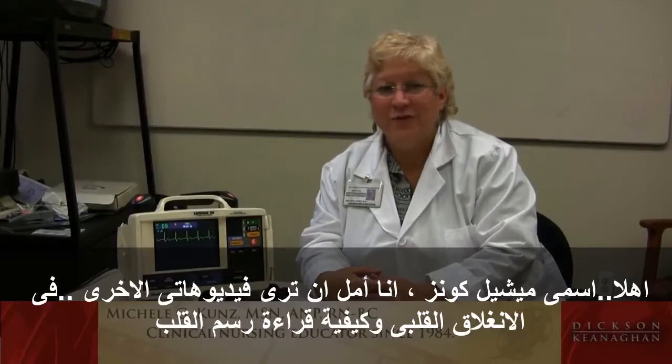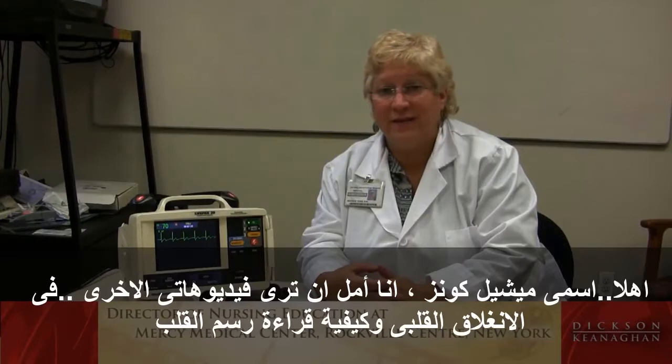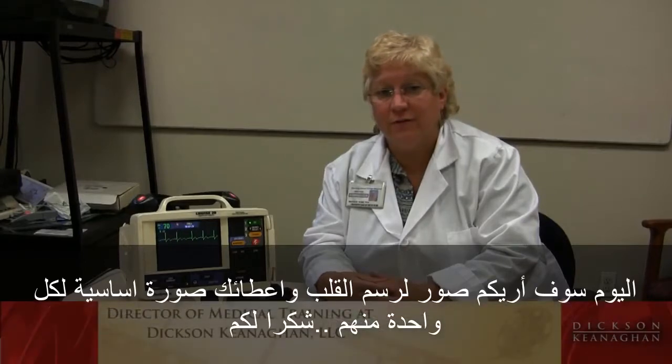I'm hoping you saw my other videos on heart blocks and how to look at a basic EKG picture. Today I'm going to show you EKG strips and give you a basic overview of each one.